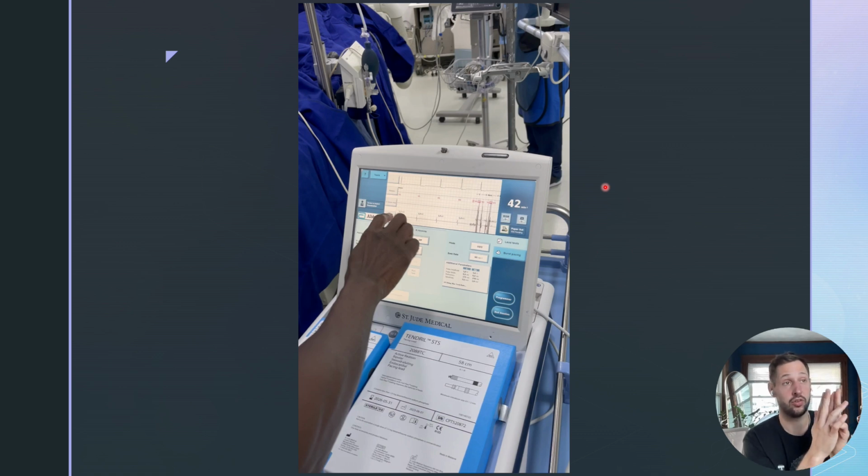If your impedance is too low, same thing. Maybe the covering, those little rubber coverings, has backed off, and now those clips are touching, or they're touching at the tip. That will also cause a short circuit, which will lower impedance. Check that first.